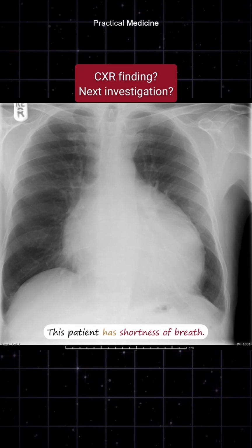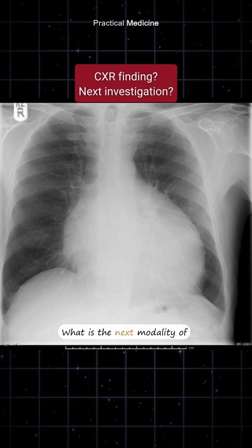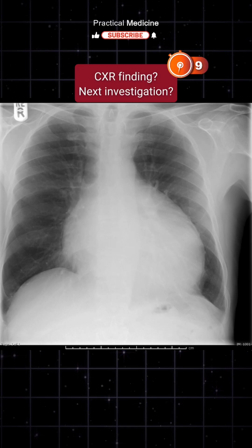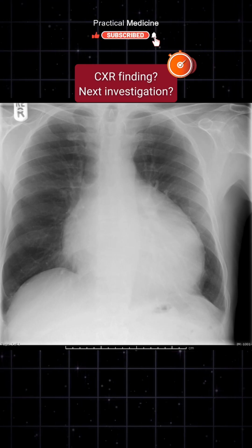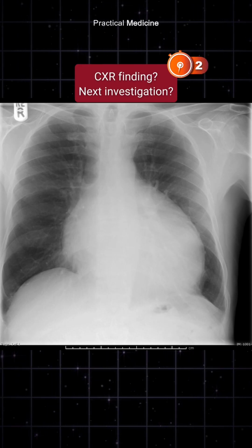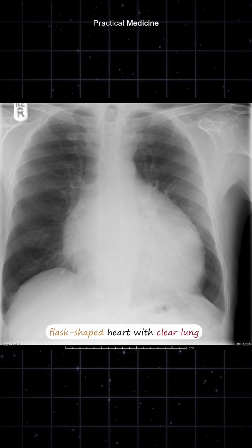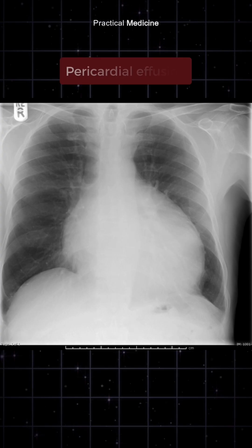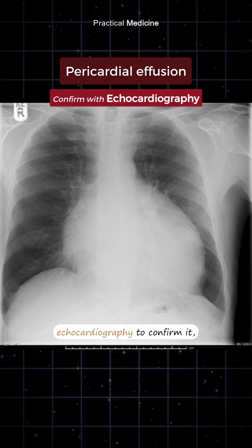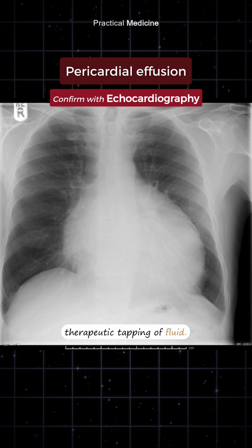This patient has shortness of breath. What is the finding on the chest X-ray? What is the next modality of investigation? This radiograph shows an enlarged flask-shaped heart with clear lung fields. This is a pericardial effusion. Next investigation shall be echocardiography to confirm it, and possible diagnostic or therapeutic tapping of fluid.